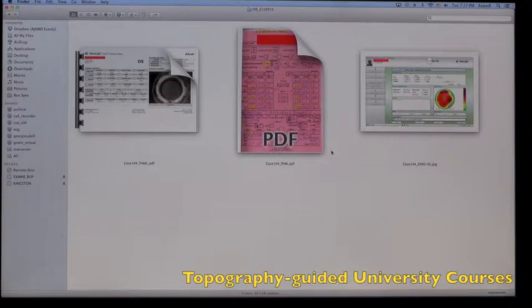On the right-hand side, we can see we've included for each patient the topography-guided plan if we had imported the placido disc topography into the WaveLight treatment platform with all refraction chosen to be 0. So on that platform, let's zoom that picture. Thank you.